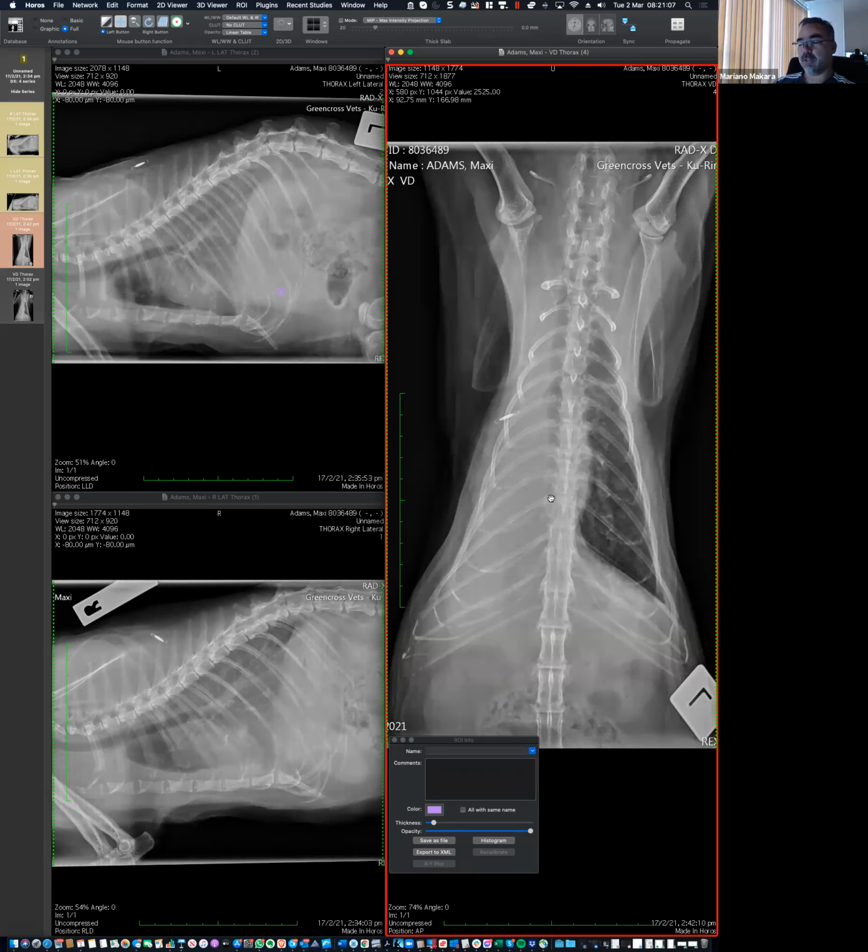And in addition to that, as you pointed out, that could also explain why we don't see a mass effect. Makes sense? So whatever is happening in that lung is replacing the air with fluid, but it's not large enough to act like a mass and displace the heart away, for example, or the mediastinum. So in my eyes, that hypothesis is closer to what is going on.